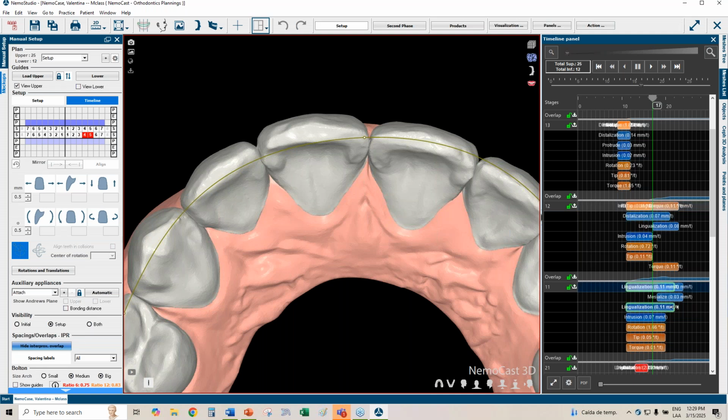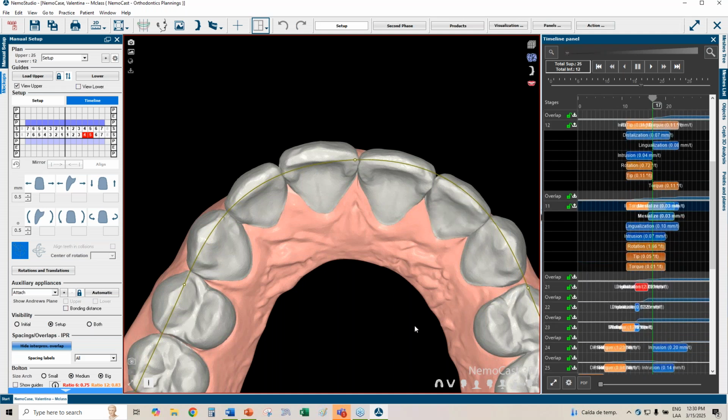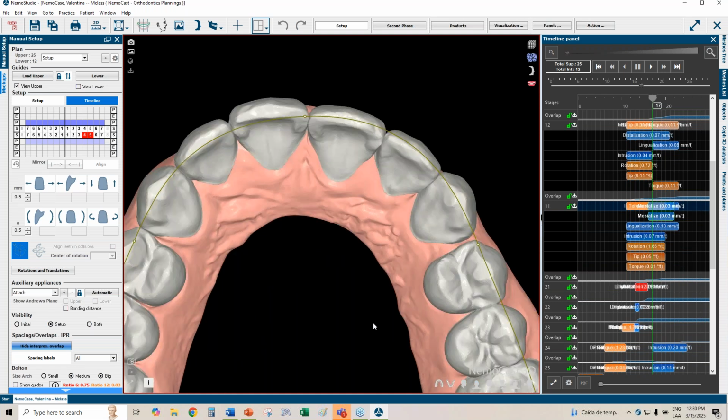Then this lingual portion, right? I could make it a little bit different. And what I'm doing is trying to manage the spaces so I don't have to perform IPR before all my rotations are in place. Okay, let's do both sides.